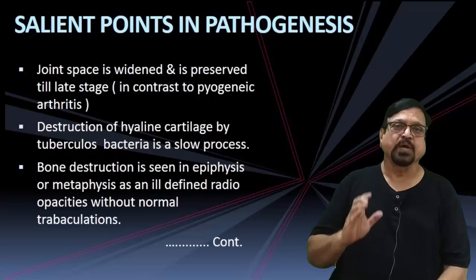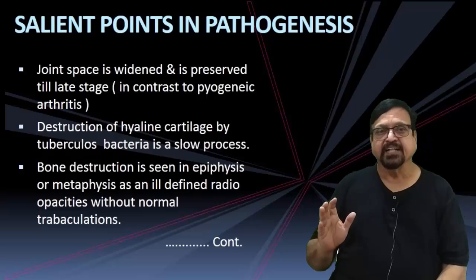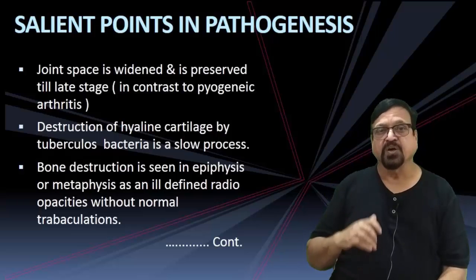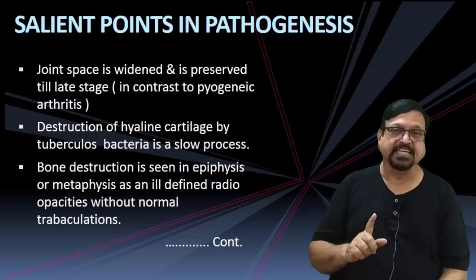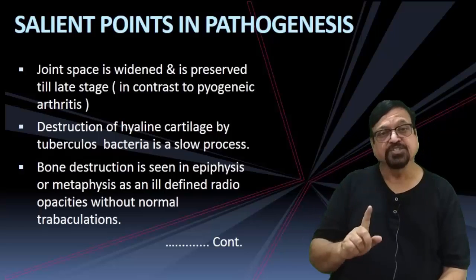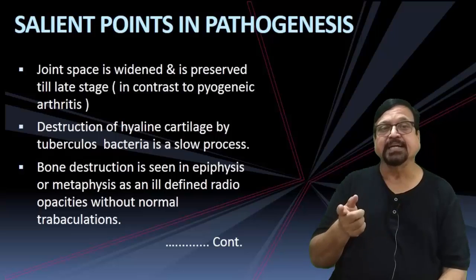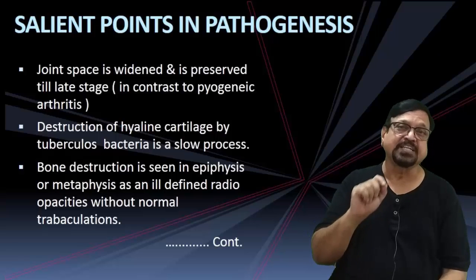Now let us come to radiological diagnosis. We have taken an X-ray. One of the most important aspects is the patient's history taking: which joint is affected, what is the duration of the affection, how many joints are involved, whether it is a single joint or multiple joints, and whether the presentation is symmetrical or asymmetrical. In the history we have to take all these details.